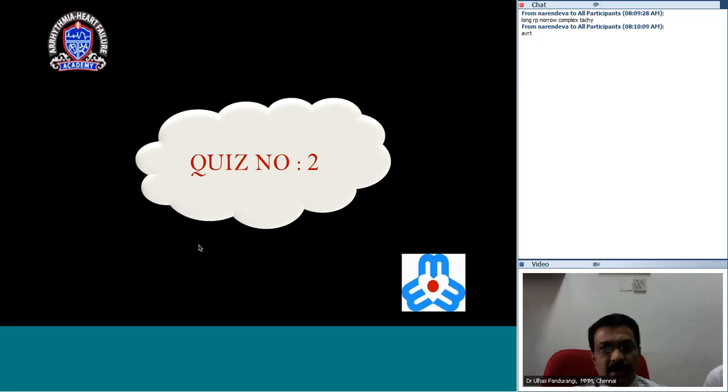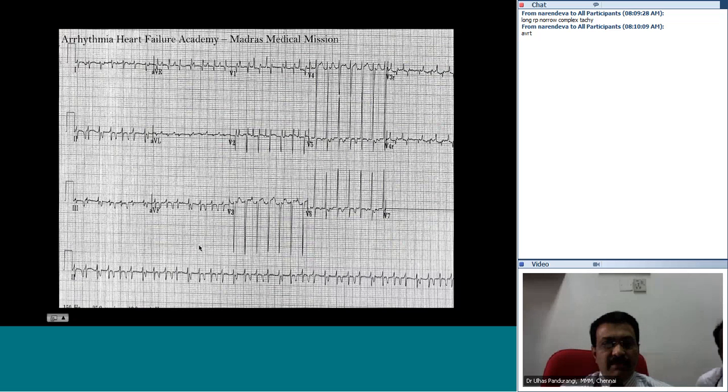How is this tachyarrhythmia, and what could be your diagnosis? Let me lead you through some of the characteristic features of this tachyarrhythmia. It's a very, very narrow QRS tachycardia. In accordance with the age of the patient, who is under 2 years old, a baby, what you notice here is an extremely rapid tachycardia.